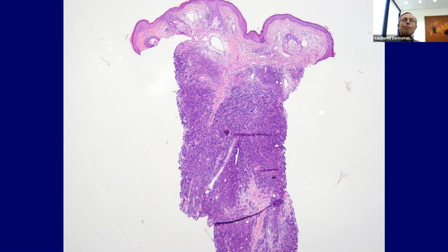Okay, here we've got a punch biopsy of something in the dermis. Low magnification. No epidermal involvement, mostly the lower dermis. And the cells are blue and they're diffuse, and they punched into the middle of this thing, so we don't know anything about the breadth, the symmetry, the circumscription. Is it an inflammatory or neoplastic process? Well, if it's inflammatory, it's got a lot of dark, deep blue cells and they're too big for classic lymphocytes. So even at low power, we say something ain't right about this. This doesn't look good. And it even goes all the way to the fat.